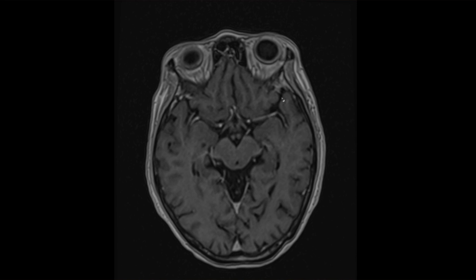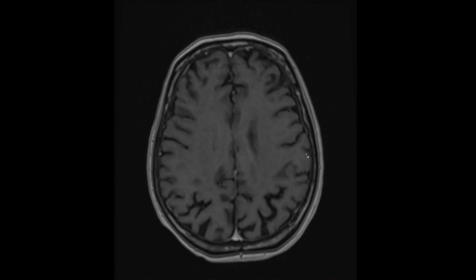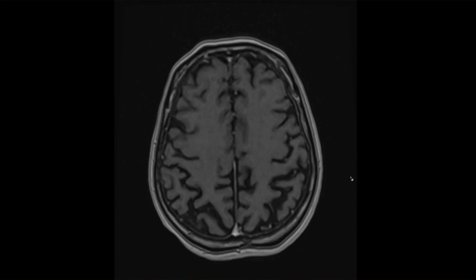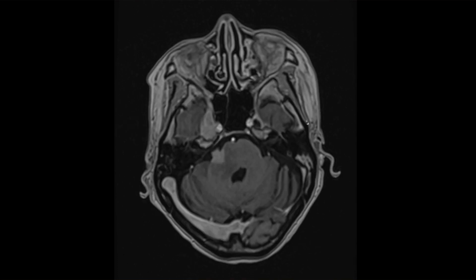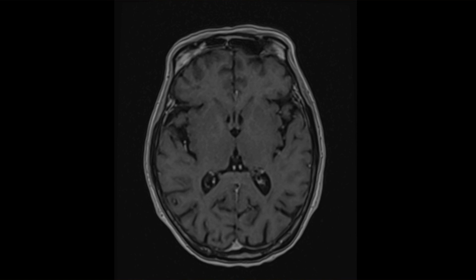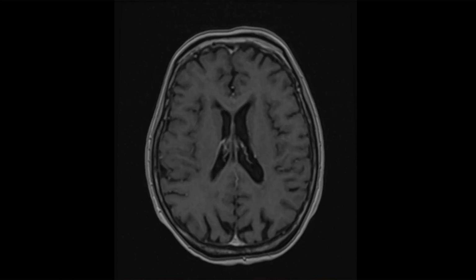You could also see contrast around the edges of the brain on this sequence. Maybe if there's like leptomeningeal spread of tumor, maybe meningitis, things like that. You can see tumors along the dura, or tumors on the face or like the skull. Any type of tumor inflammation, you'll see increase in enhancement, like acute MS flares, for example, multiple sclerosis flares.